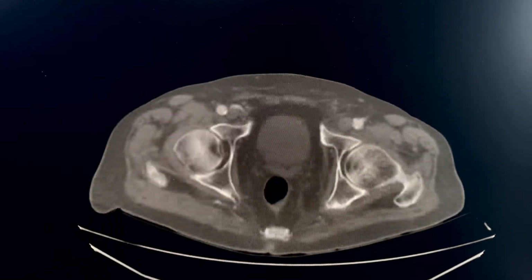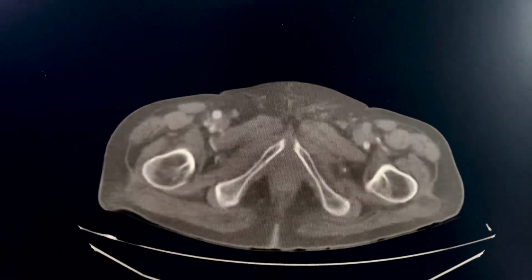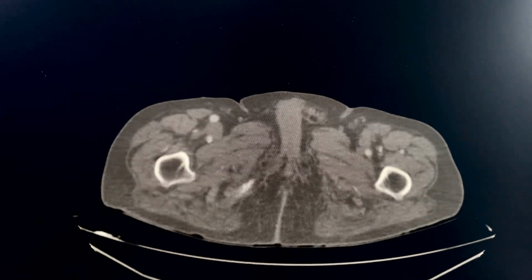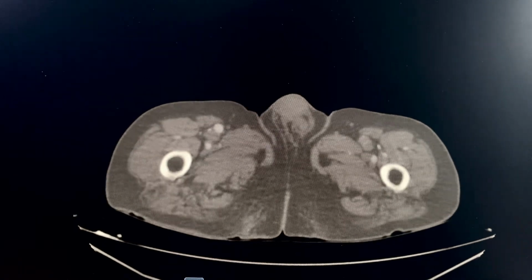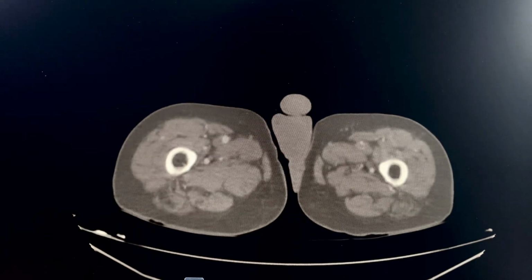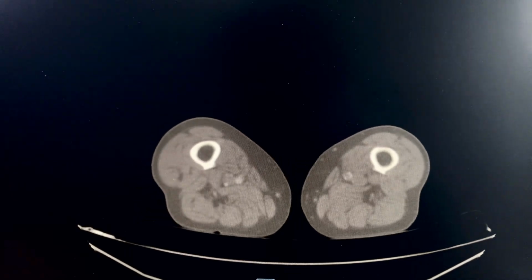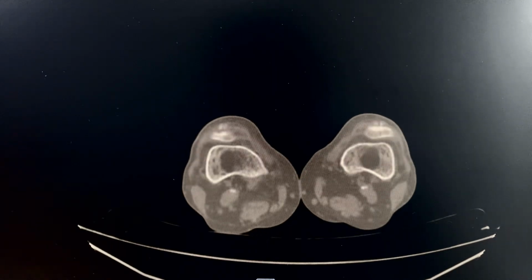common femoral artery. And on the right, you can see that the common femoral artery gives off the deep femoral artery and the superficial femoral artery. The right leg, there was no complaint concerning the right leg, right? And you can see a common femoral vein here between the two femoral arteries. So the right leg is not in pain, right? And you can see how the superficial femoral artery goes very nicely down, yes, with some stenotic changes along the way, but fairly patent.